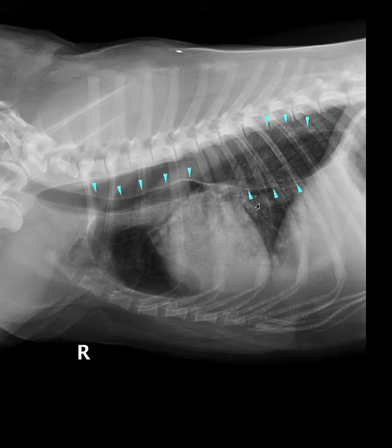I'm calling it cranioventral because on the lateral view, we would see that it's mostly this increased opacity superimposed on the heart in the left cranial and right middle lung lobes. Whereas in the caudodorsal lung fields, of course the esophagus is superimposed, but we can see adequate visualization of pulmonary blood vessels. So to summarize, here we have a classic case of diffuse megaesophagus with secondary aspiration pneumonia.